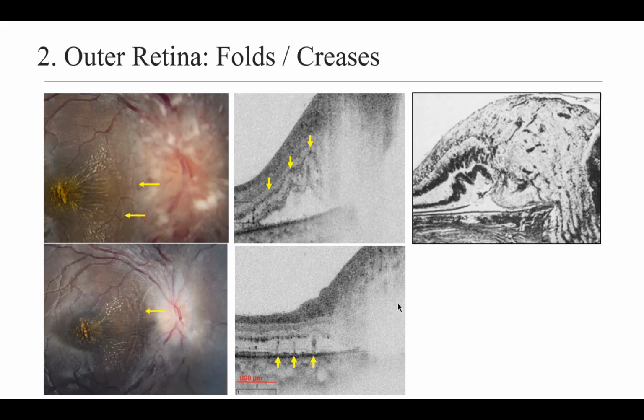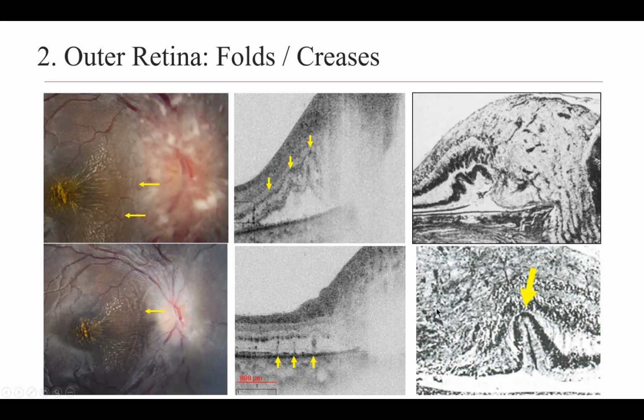Despite the fact that I had read Paton's paper multiple times, I went back and realized that Paton already had the answer. He had one photomicrograph, which I had overlooked, which basically told us what this was. What you can see here is a deeply furrowed, self-contacting crease in the outer layer. That's what these lines represent.